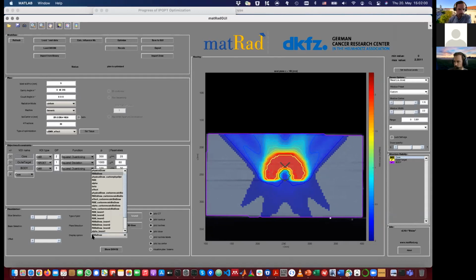All right. Then, if you haven't taken any screenshot, then please do so. I guess now we can move on to task number 2. Or is there any question from the audience related to this case? Otherwise, I will continue. So we move on to task number 2.